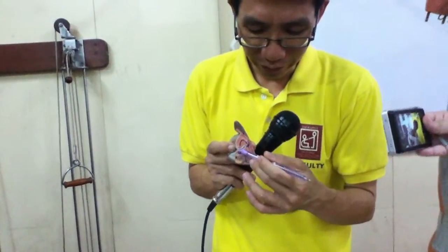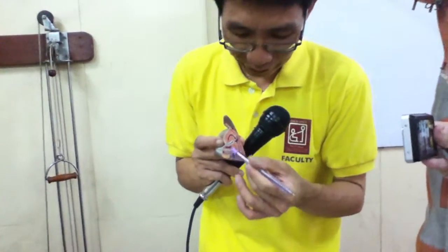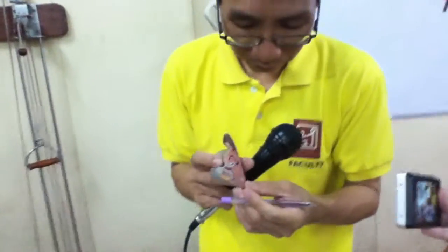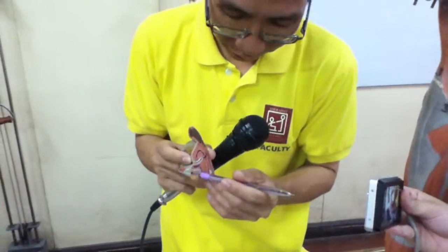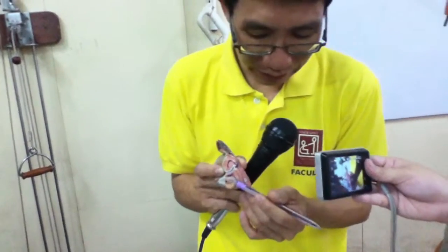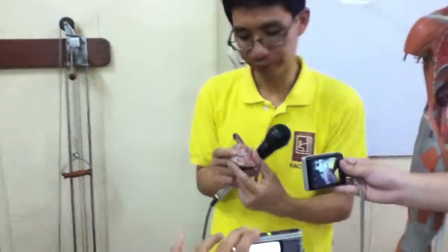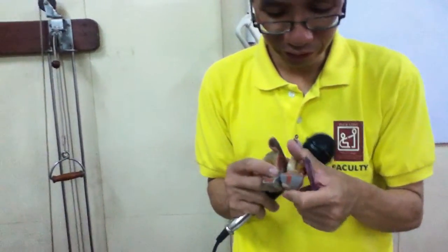So this is where your urine is being stored. So below the urinary bladder, this one, that would now be your urethra. Urethra. Okay. Then, above the urethra, the position is this one, the more gray one. This is where the location of your glans clitoris is. So your glans clitoris is on here. Okay? So your glans clitoris. Okay, clear? Yes. So any portion that you missed?